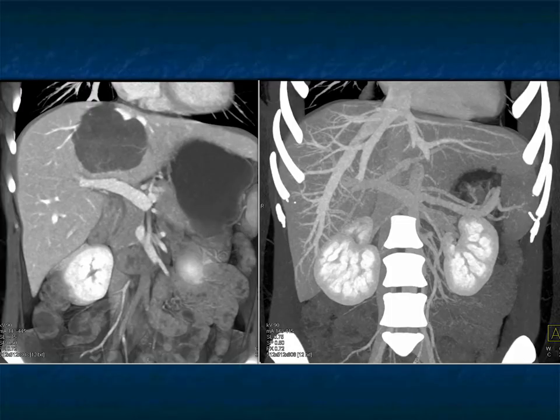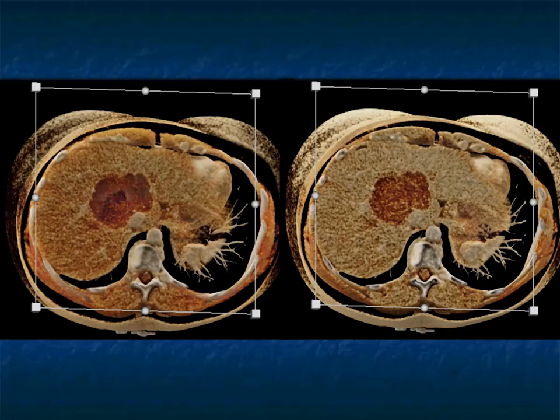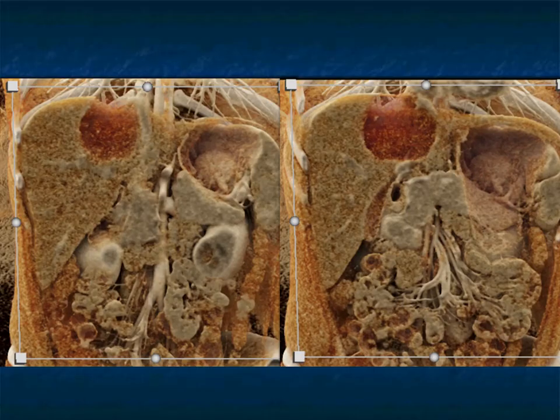As you do the 3D mapping of the portal vein and the hepatic veins, there's no abnormal vascularity, but this lesion has mass effect and it's low density. Could it be a cyst that bled? I guess that's a possibility. That may explain the higher density. Here's a cinematic rendering. It has that appearance of a cystic lesion, but it looks like there's scalloping along the lesion. You're not going to see scalloping on a simple benign cyst, so that becomes a little bit more problematic to me. What are we dealing with?